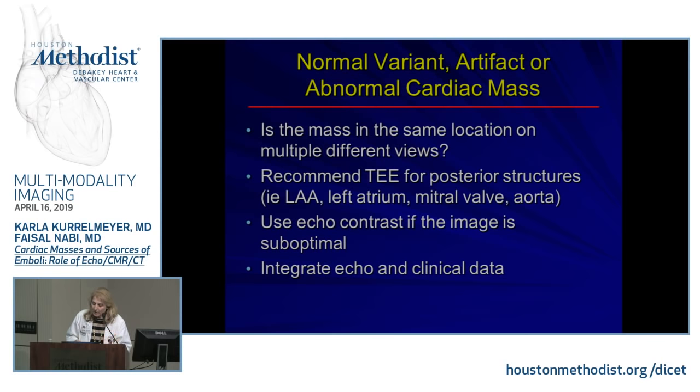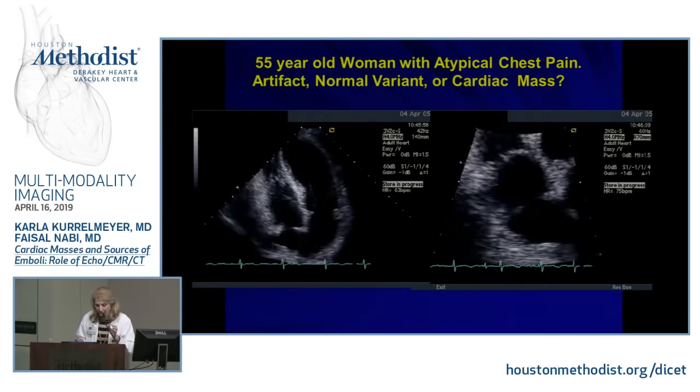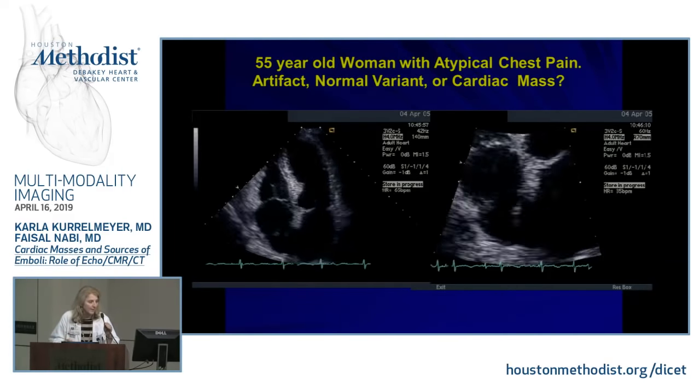You should use echo contrast if the image is suboptimal, and we'll show some good examples of that, especially in that LV apex. And you really need to integrate your echo with your clinical data when you're trying to determine whether or not it's a pathological mass.